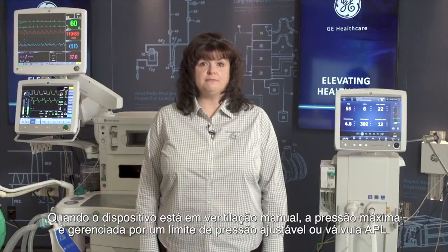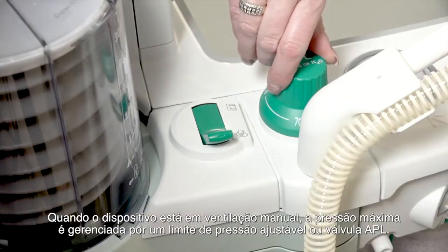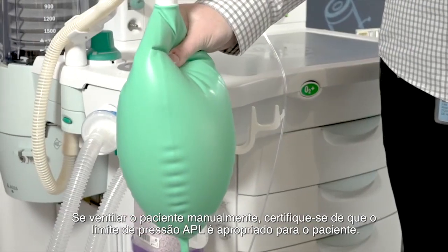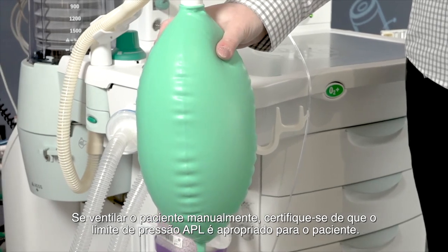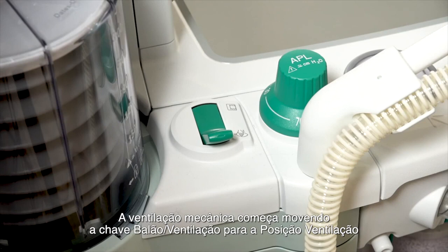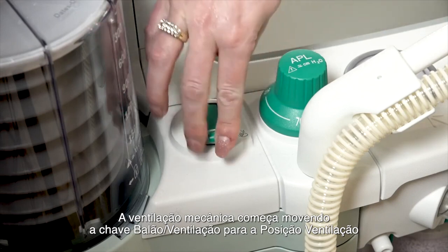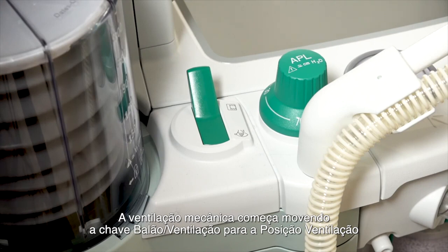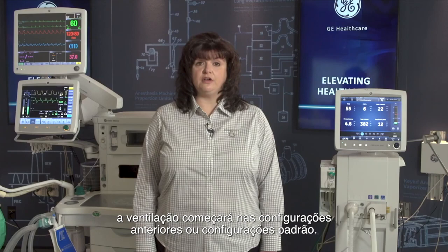When the device is in manual ventilation, maximum pressure is managed by the adjustable pressure limit, or APL valve. If ventilating the patient manually, ensure the APL pressure limit is appropriate for the patient. Mechanical ventilation begins by moving the bag to vent switch to the vent position. Ventilation will begin at the previous configured or default settings.